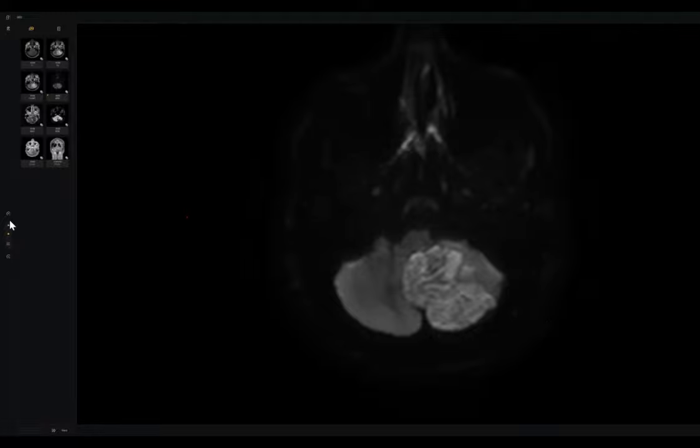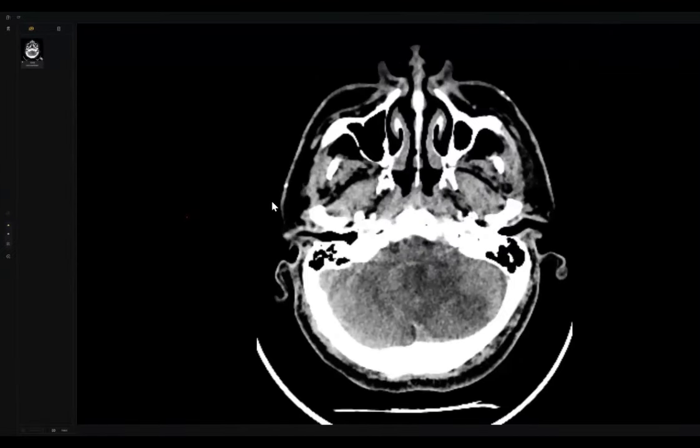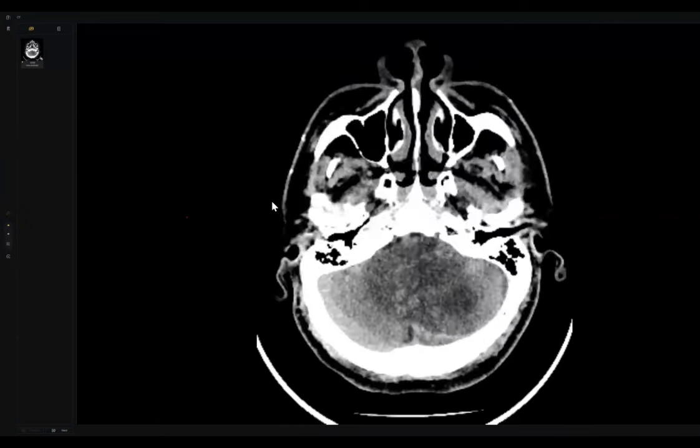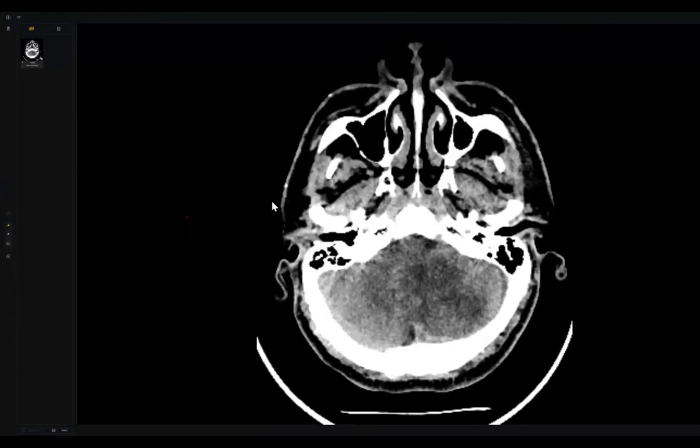Thank you so much, doctor. This case was confusing. Leave the mouse, please. Why was this case confusing, my colleague? Because of the CT. From the first look, it looks like a malignant or space occupying lesion. Really ill-defined, irregular.